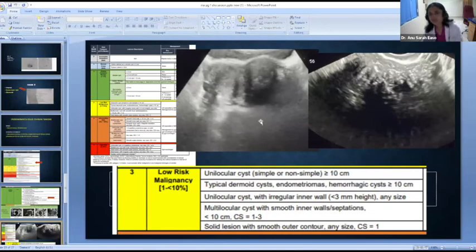This is the ultrasound image of the same patient. Actually, in ultrasound, it was more suspicious of a broad ligament fibroid. Due to the inadequate window, we could not really rule out whether the ovary is near the lesion, whether it's actually a broad ligament fibroid. So with MRI, it was clearly arising from the ovary, and we could nail a diagnosis of an O-RADS category 2 lesion.